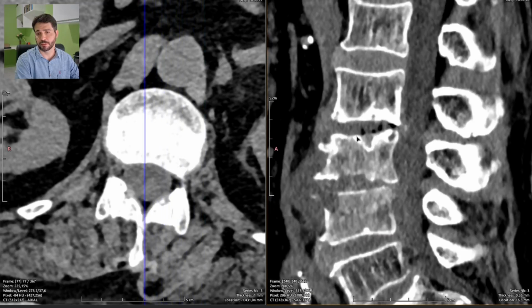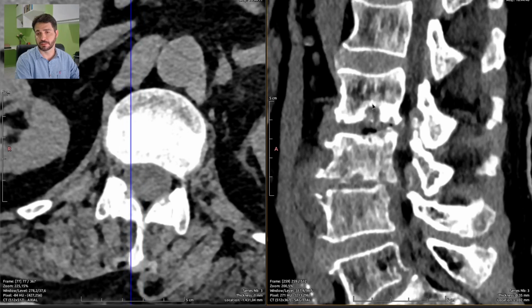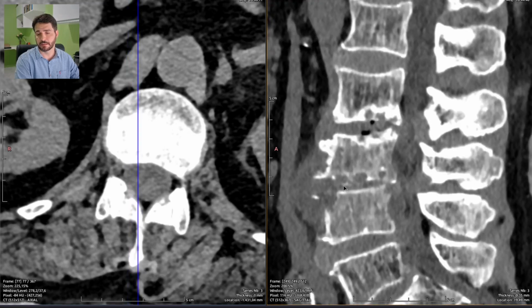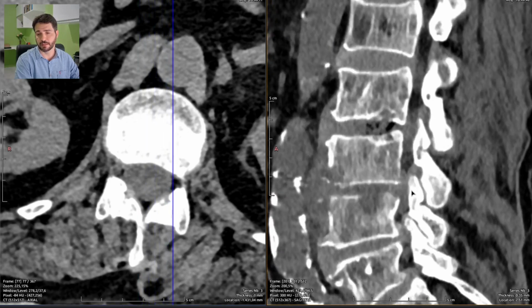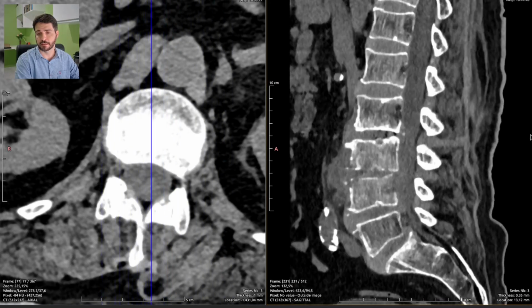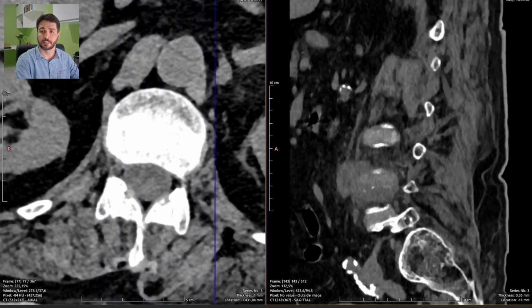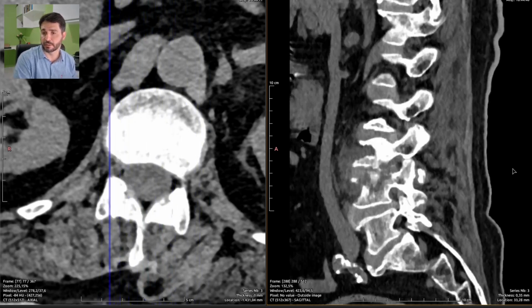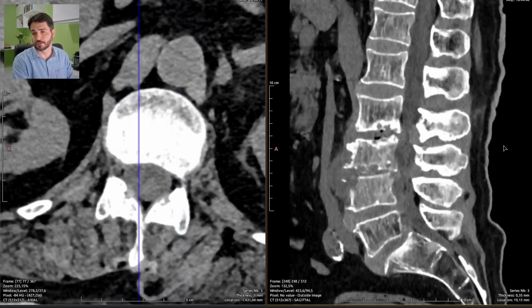See, sclerotic margins, osteolytic. So this is degenerative, this is degenerative, this is secondary, but this isn't the same. This has no sclerotic margins, this is ill-defined. So if it's ill-defined, it's dangerous, it's very, very ill-defined. So I guess these are actually tumoral, neoplastic, secondary, metastatic lesions.